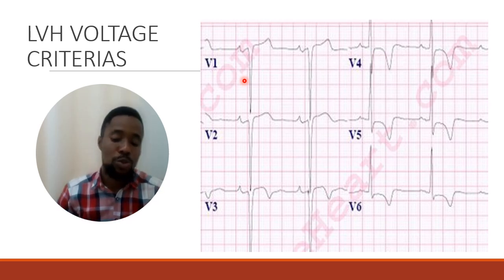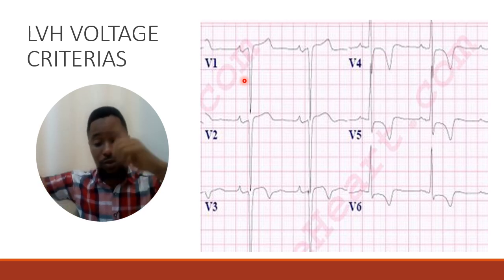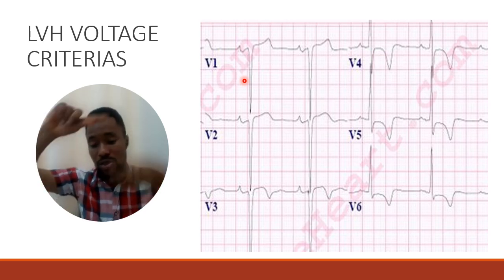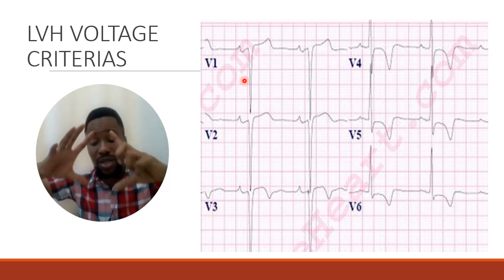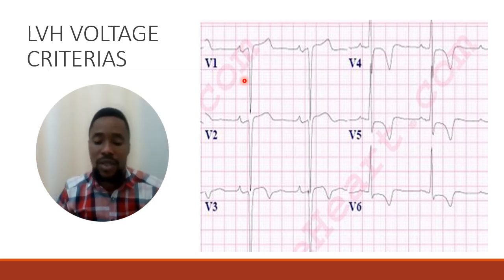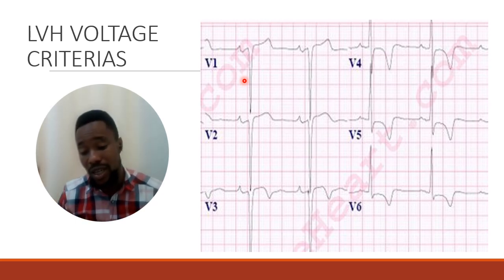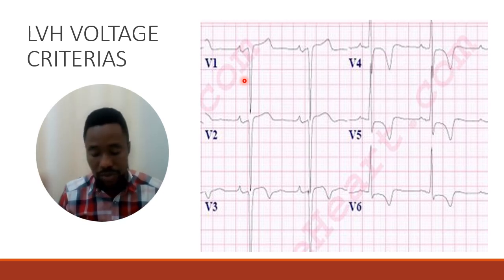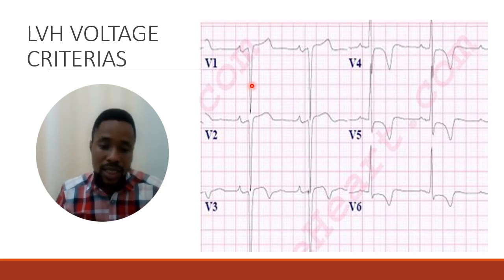So biphasic, it could be biphasic in V3 and V4 because those are the transitional points where the R wave progression somersaults. It starts small, increases in V2, gets bigger in V3, then V4, V5 get bigger, bigger like that. So if you have poor R wave progression, it could mean LVH, it could mean heart failure, it could mean so many things. Now, that's that about that. Let's quickly go to the next thing because of time.